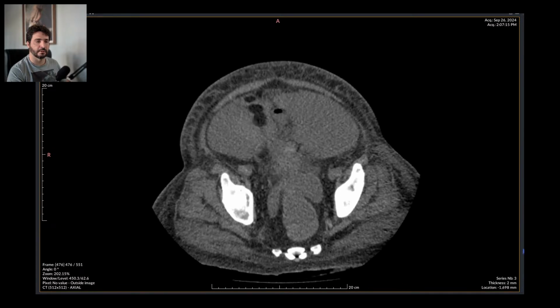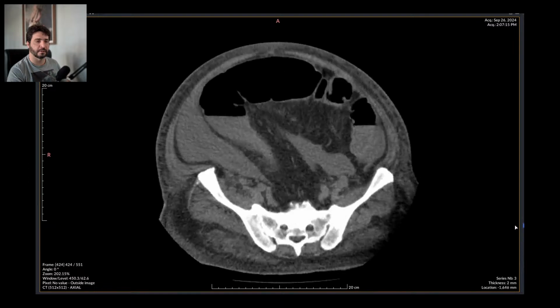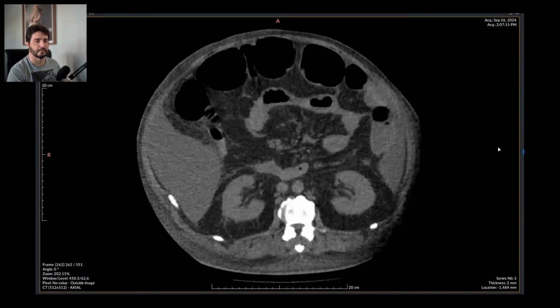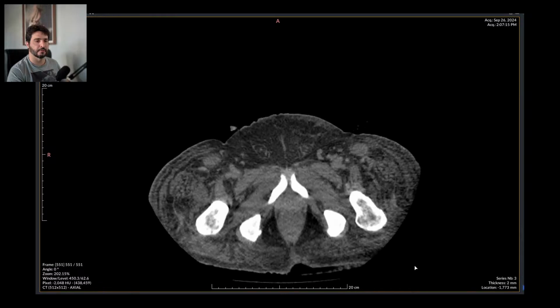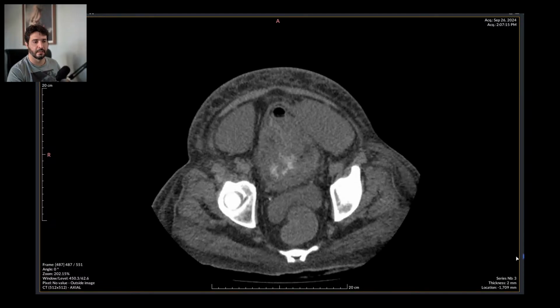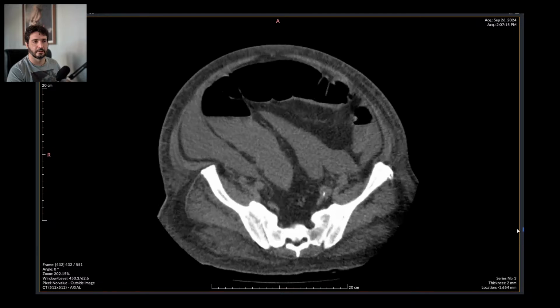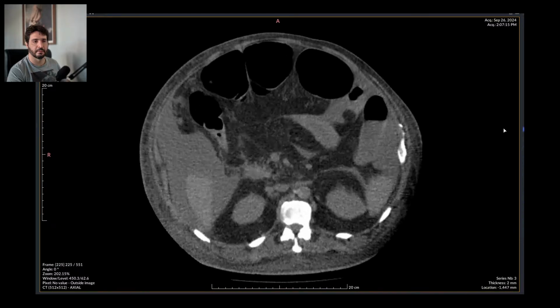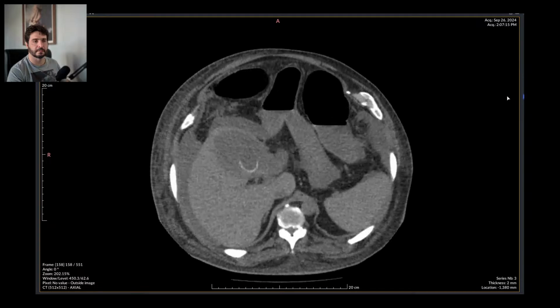Oh God, I just hate these partially scanned abdomens. Just hate it. It's not difficult to do a proper abdominal scan. Just scan the freaking patient. For God's sakes.